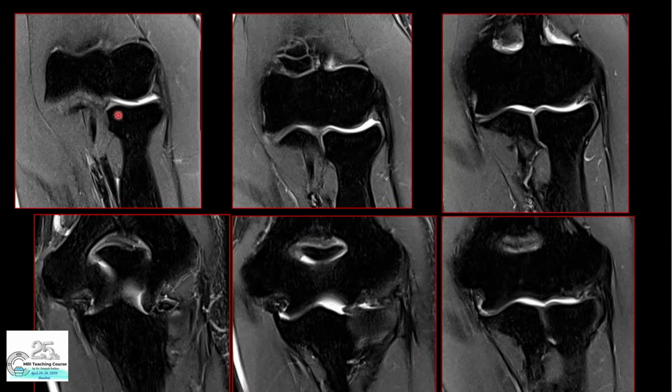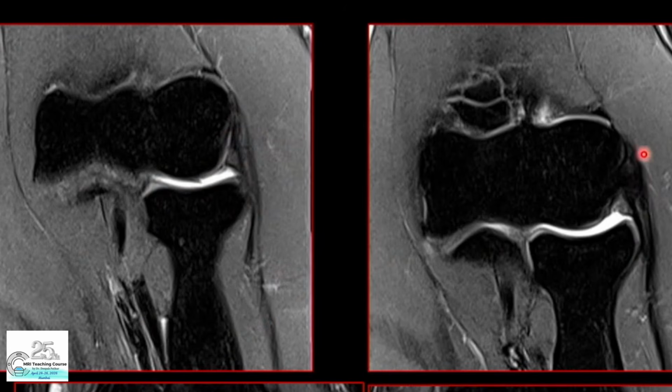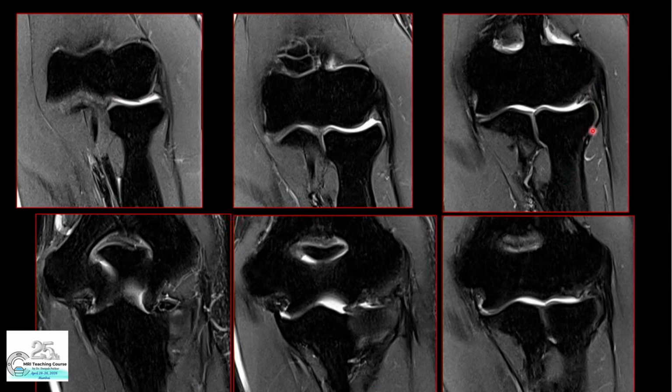So we see that anatomy. Again, the coronal images are good for looking at it. That outer structure, this one, is the common extensor tendon. Beneath that, you're seeing from the inferior aspect that structure going towards the annular ligament. Since this is anterior, this is the radial collateral ligament proper. And then you see this structure. You see how it goes and cradles the radial head and then attaches to the supinator crest of the ulna. This is the lateral ulnar collateral ligament.